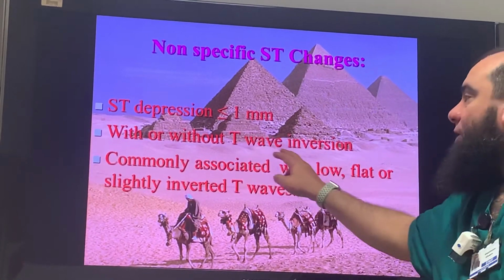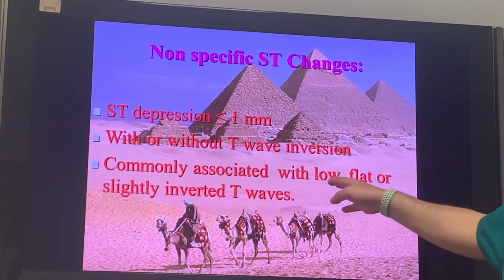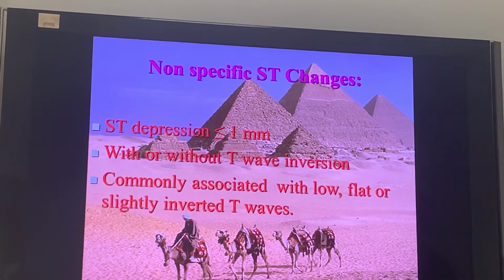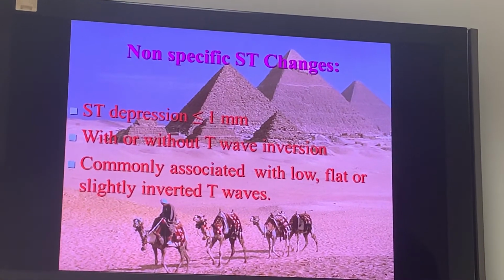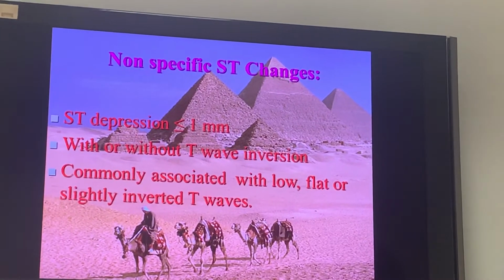It could be with or without T-wave inversion, and commonly associated with low, flat, slightly inverted T waves. So we cannot diagnose. I didn't give an example for that because the important thing is to get the specific one, and the non-specific is non-specific.